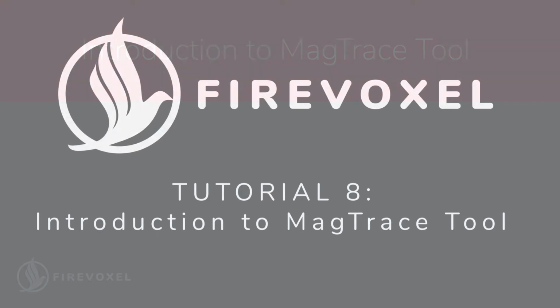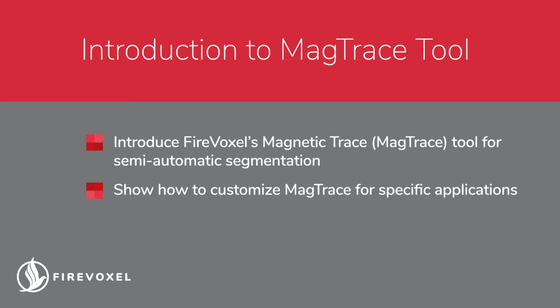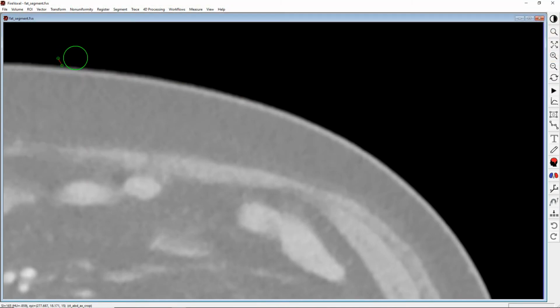In this tutorial, we will introduce FireVoxel's magnetic trace tool for semi-automatic segmentation, show how to customize its properties, and demonstrate how to use it to segment organs and tissues. The magnetic trace tool, or MagTrace, allows you to draw a vector contour by placing a series of control points connected by a cubic spline curve.